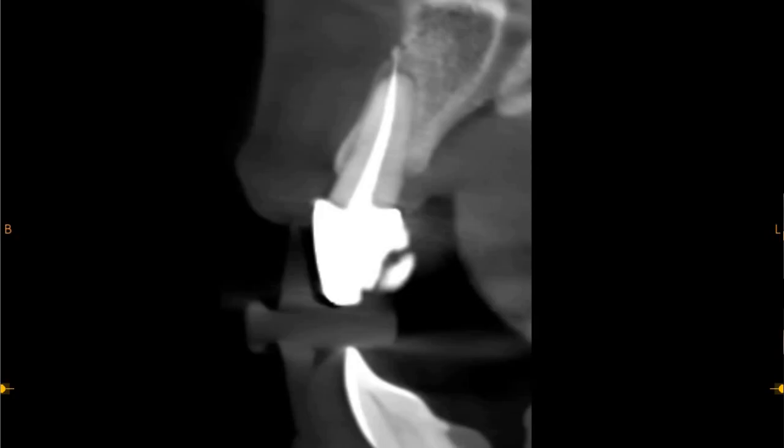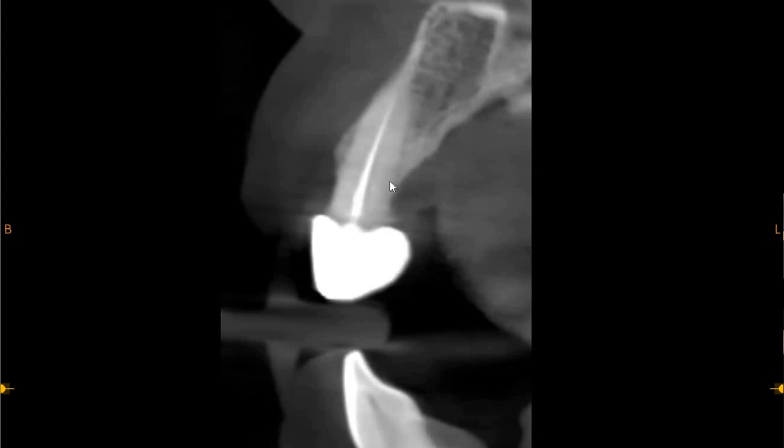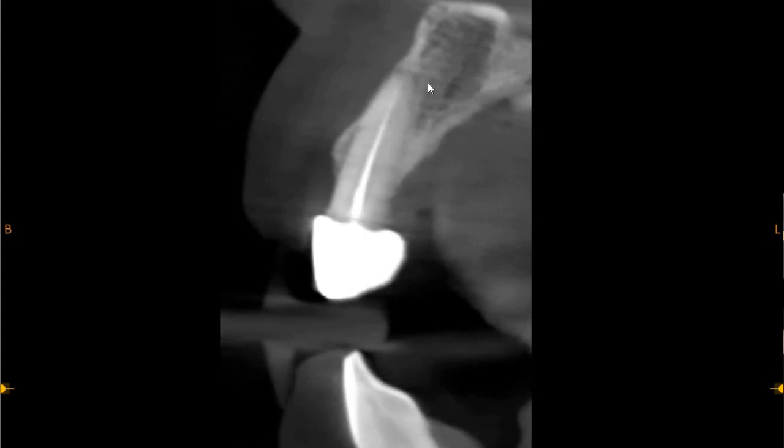Moving to the upper left lateral incisor, here we can see that the obturation is again not very adequate. We can see voids present in the middle and in the coronal third. We don't, however, see any periapical radiolucencies, and we don't see any overextended GP present. We do see overhangs present in the restoration.